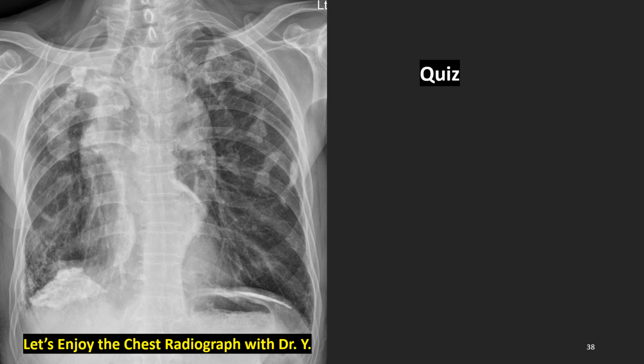This is the image for next session quiz. What do we see? Somewhat bizarre shaped densities here and there, almost everywhere. What is this?